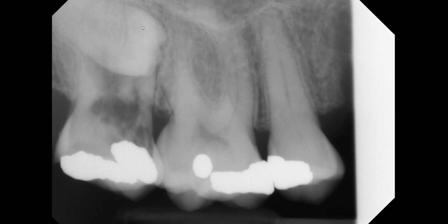And also, if you decide to extract the third molar at the same time, it would be a very difficult extraction and may end up causing a large bone loss and subsequent alveolar ridge defect when you attempt removal of this third molar. So it's not an easy case, right? Extracting number 2 alone may cause potential complications with healing, and even if you decide to remove this, again, you're going to cause a lot of bone loss.